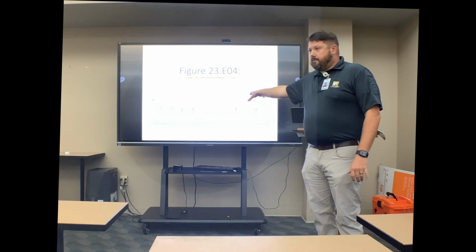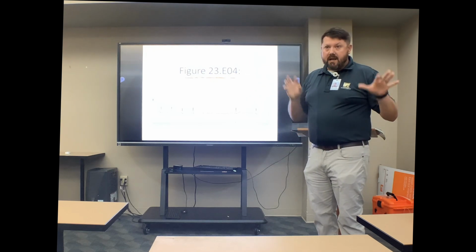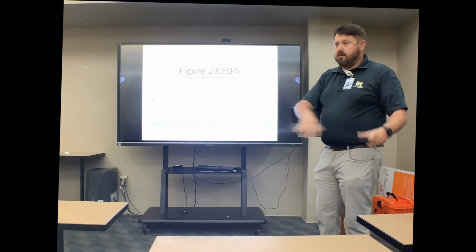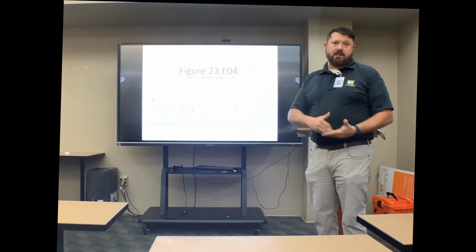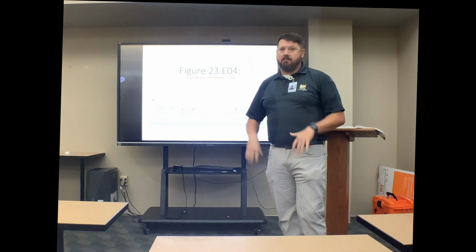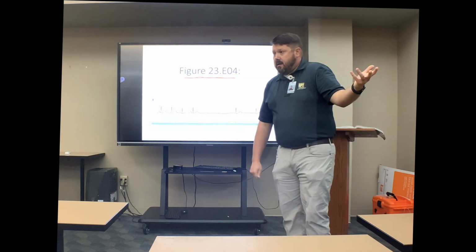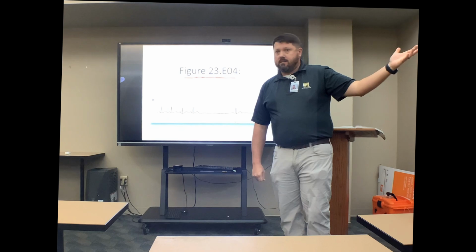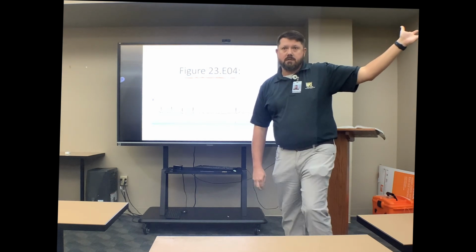All right? So using what you've already learned, that's how stuff builds on here. Using what you've already learned, you're able to figure out what's happening here. Now, we don't know the patient's history. We don't know exactly what's happening, but just off of this visual graphic here, they were in a sinus rhythm. They went into sinus arrest. The AV node said, okay, here we go, Leroy Jenkins. Let's do this, boys.